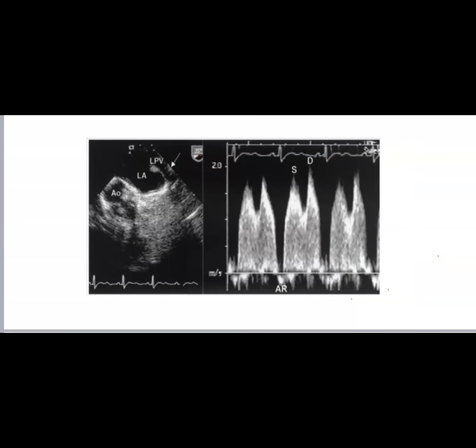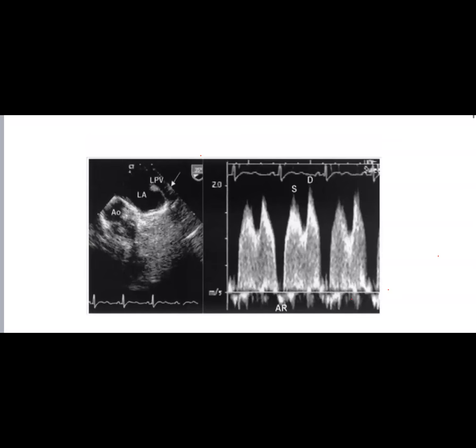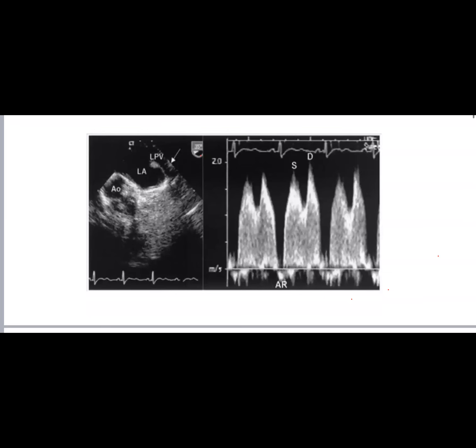What does that mean? Yes, we have augmented the diastolic flow in the pulmonary vein. It may go with a severe diastolic dysfunction. A severe diastolic dysfunction, like what we have discussed, we usually have AR. We have AR. So the AR tends to be large and big. The AR is down here. Okay, this one.